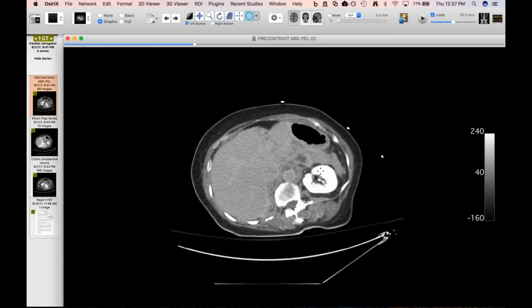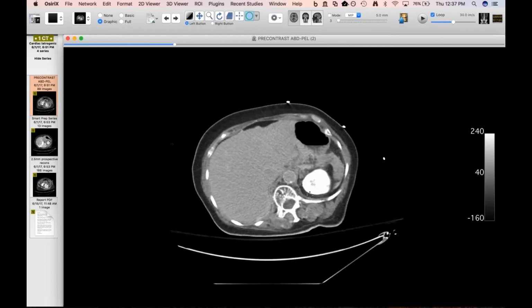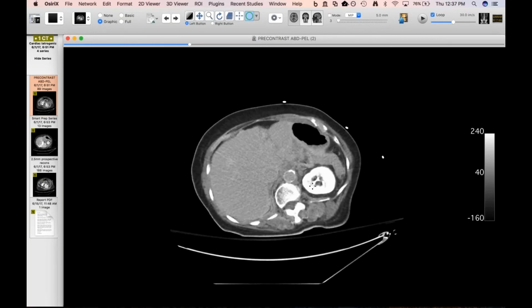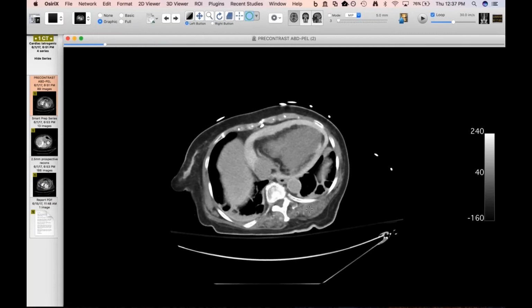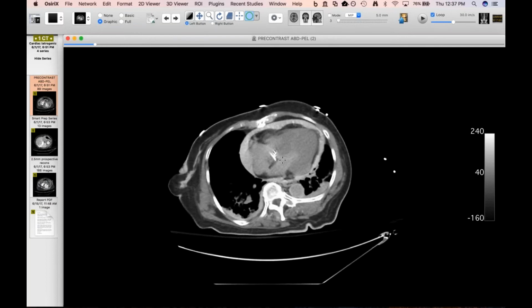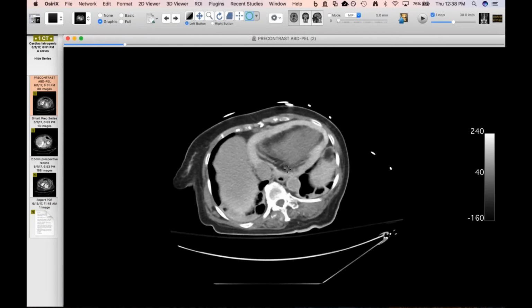I remember we used to think that this was pathognomonic for contrast-induced nephropathy when you had retention of contrast hours or days after another exam. I mean, clearly it's indicative of reduced renal clearance. I guess the question nowadays is whether it is due to the contrast, or just due to something else with reduced function. But even her atelectatic lung looks high attenuation for a non-con, and clearly you can see that she's got contrast still in her chambers too. So they must have given her a lot of contrast, and it's just clearing extremely slowly from the procedure.